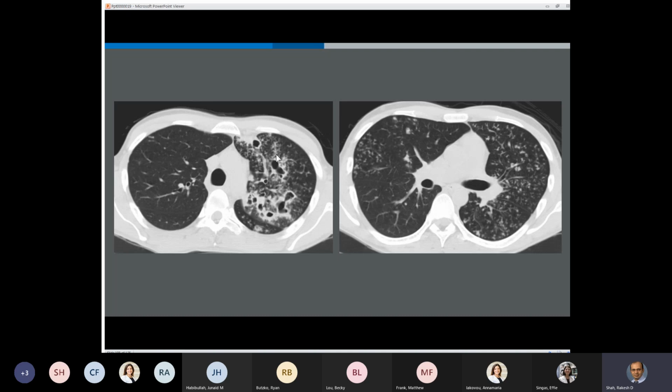As you know, this is a patient who has cavitary lesions in the left upper lobe. You can see that they have tree and bud opacities. And when you see this picture without even any history, the first thing to think would be that this patient has reactivation TB with endobronchial spread. And of course, you put everything together, and yeah, this is a patient with that condition. So when you see this, you want to put them in isolation because they're infectious to themselves and to others.